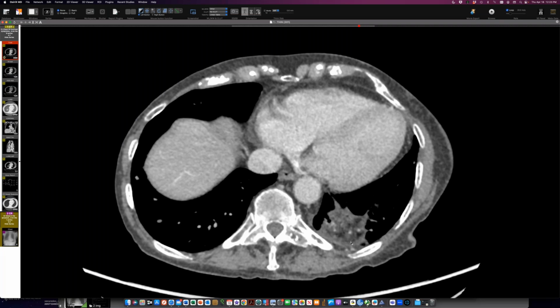I've not seen histo. I mean, when blasto is a mass, it usually looks like a nasty lung cancer, and you might see little cavitations, but you don't usually see much in the way of airways. Like histo and the cocci cases we see, which we see a fair number because they all come back here after spending the winter down in the Southwest. We just had one yesterday. I don't recall seeing air bronchograms in any of those lesions because there's so much inflammation. It's not alveolar filling, it's a big inflammatory process. Whereas organizing pneumonia is just airspace problems with maybe a little bit of inflammation in the interstitium. So it makes sense that the airways themselves are preserved. Right. Got it. But that is probably the thickest atoll I've seen. Agreed. Well, okay, cool.